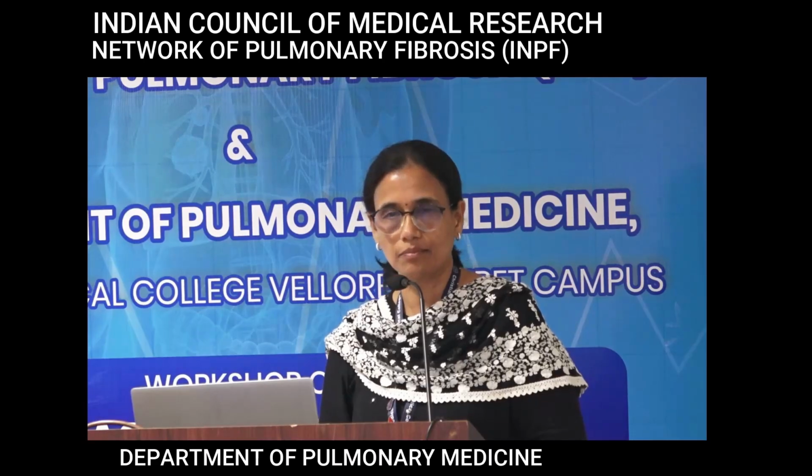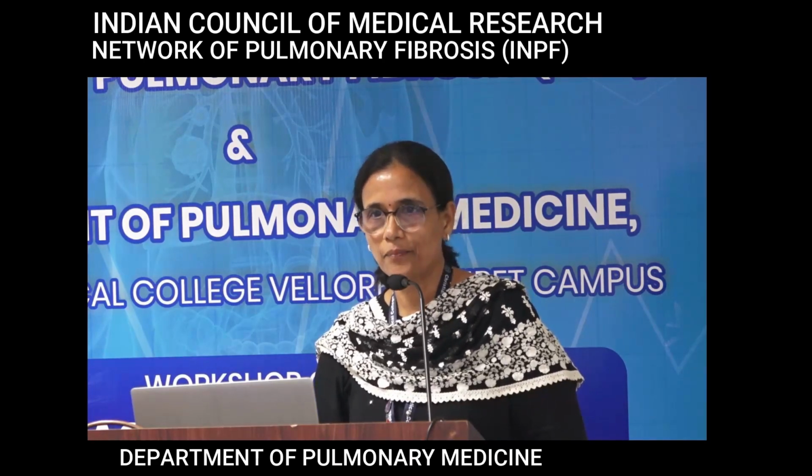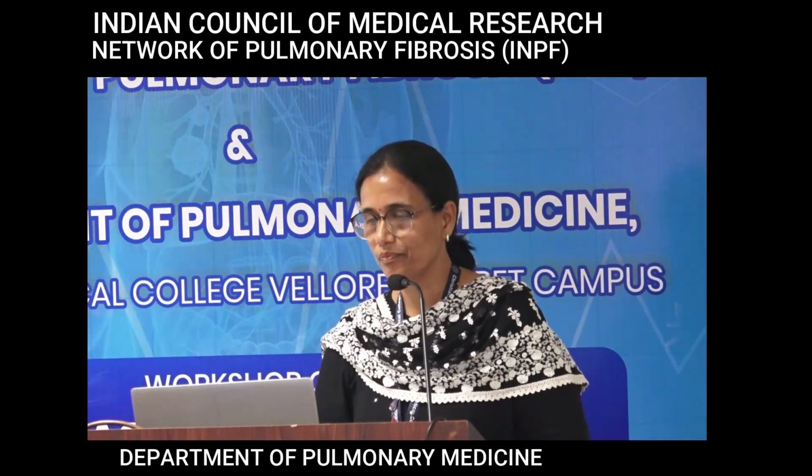So what does this patient have? He is a smoker. In the upper lobes, what do we see? There is paraseptal emphysema, and in the lower lobes we see honeycombing in addition to the emphysematous bullae. So what is this entity? CPFE, or combined pulmonary fibrosis and emphysema.